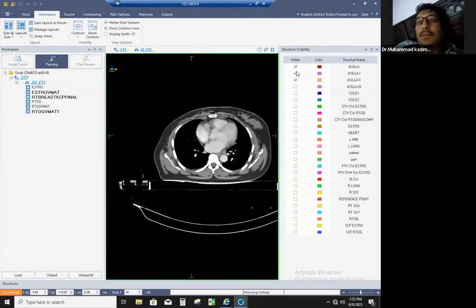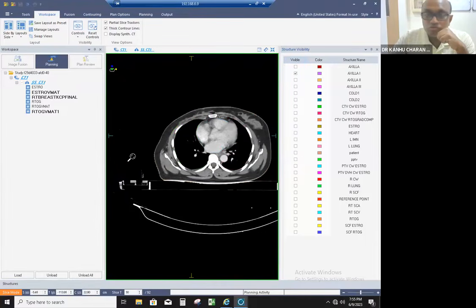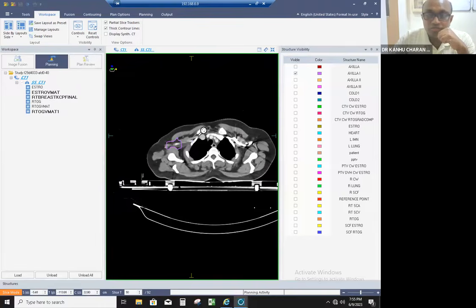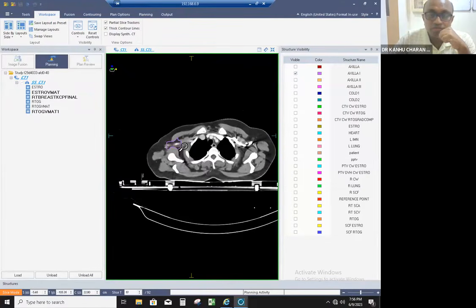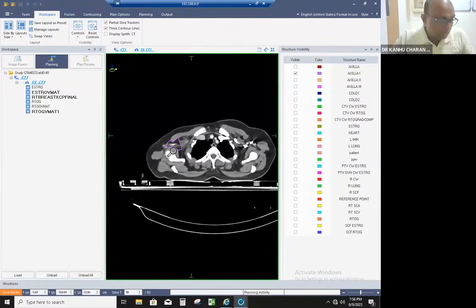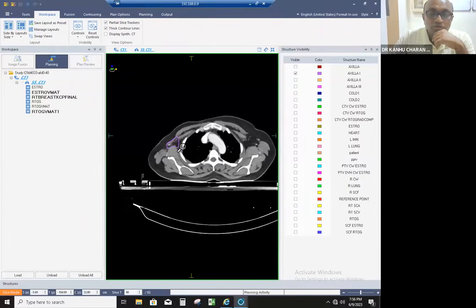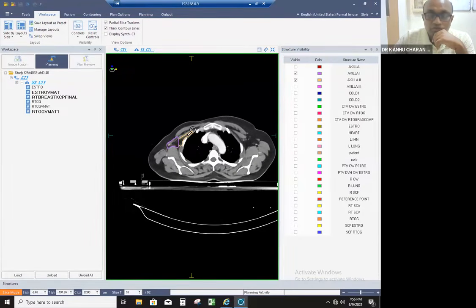Yes, please. Okay. If you want to do the contouring of the axilla, this is the pectoralis major muscle and minor muscle. You have to see the coracoid process here, where the pectoralis minor muscle originates. The area posterolateral to the pectoralis minor muscle is level 1. Then level 2 is posterior to the pectoralis minor muscle.